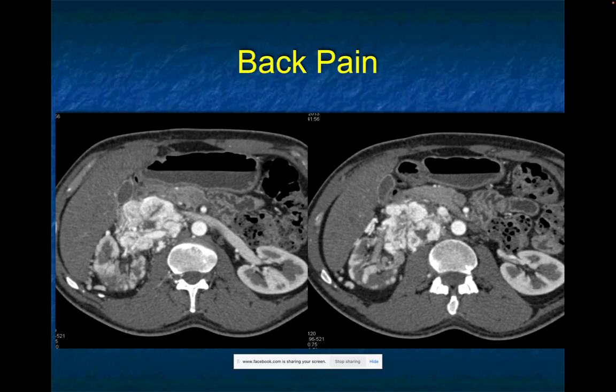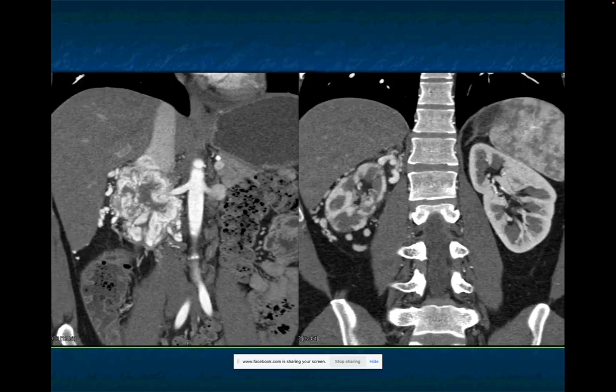What about this case? At first glance, there's a large vascular lesion. It's involving the renal artery and vein on the right side, because look at the changes in the patient's right kidney. Look at the cortical medullary differentiation compared to the normal left kidney. But what's this vascular lesion? Well, several things you can think about. You can see it here in the coronal. When we discussed this case yesterday, someone made the point, could this be an IVC sarcoma? I have to admit, in the images I'm giving you, that is indeed a possibility. IVC sarcomas can be very large, have lots of neovascularity and collateral vessels.